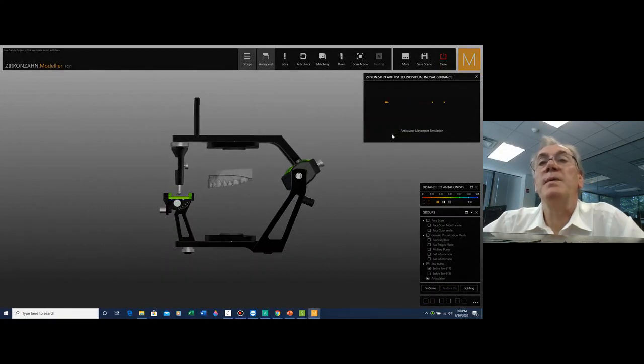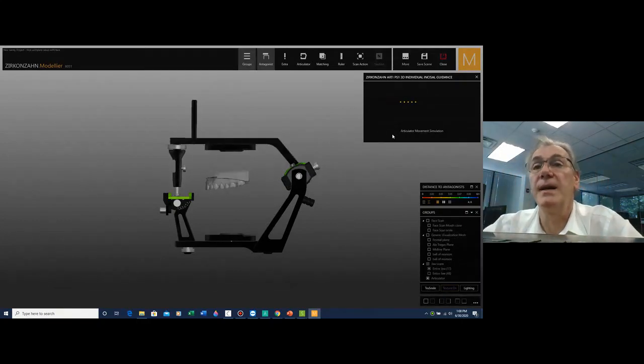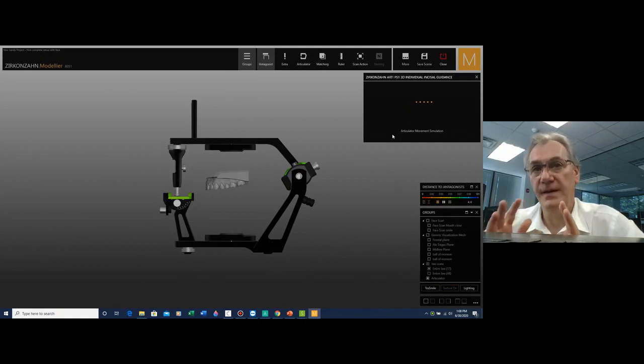This can also all be performed in an ortho software where we can move these teeth around and get a better understanding. So once we go through the procedures and the evaluations of the odontoplasty, if it is in an exaggerated position, we can evaluate everything through an ortho program and understand how much this tooth needs to be moved in order for it to be able to perform the ideal movement.